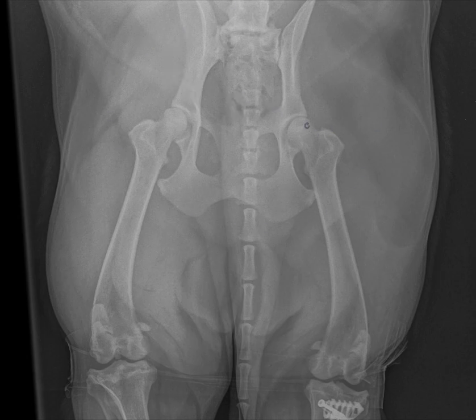For me, although there are some minor degenerative changes of the femoral neck, more pronounced on the left side than the right, the amount of hip arthritis is quite mild in this case, and overall, given the advanced patient age, I would say that the hip coverage, denoted here by the position of the dorsal acetabular margin relative to the femoral head, and the hip congruity, denoted here by the shape of the femoral head relative to the shape of the acetabular cup, so coverage and congruity, are quite adequate in this case, in my opinion.